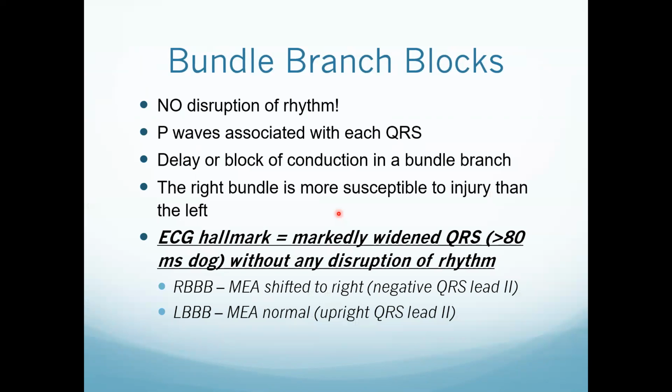So again, just touching on bundle branch blocks, they're not going to disrupt the rhythm. You're not going to hear any abnormality when you listen to these animals. They occur because we've got delay or block of conduction within one of the bundle branches. If both bundle branches are blocked, then you're going to have complete AV block, which is going to look a bit different. And right bundle branch block is going to be way more common. It's way more susceptible to injury than the left.